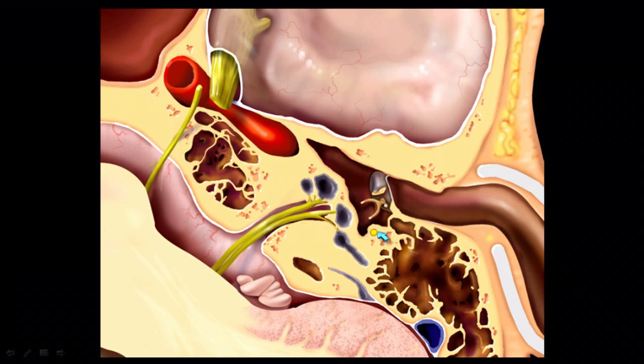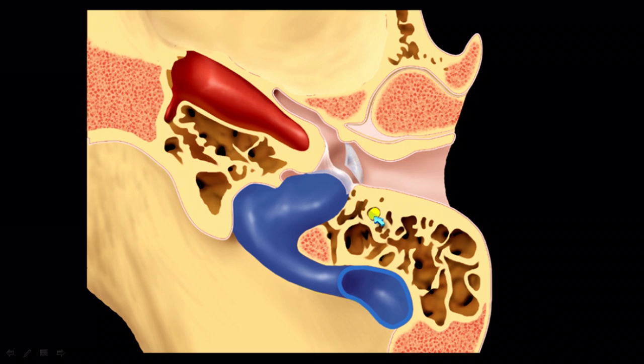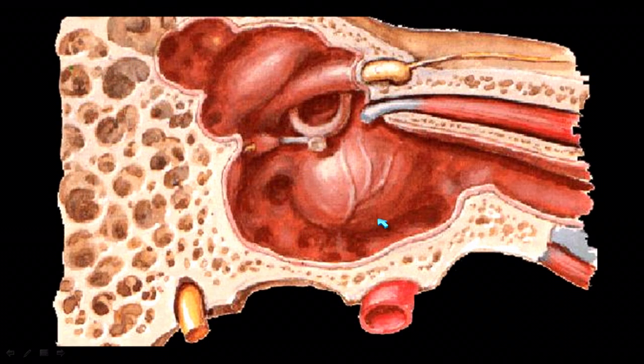So when we look at the back wall of the middle ear cavity, if we scroll up and down near the level of the EAC, it looks like there's one tube that's opacified. That's going to be our facial nerve descending or mastoid segment going down. So here, posterior to the EAC is that descending mastoid segment going inferiorly.